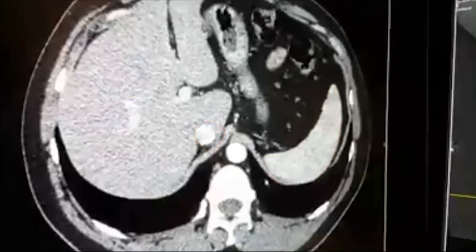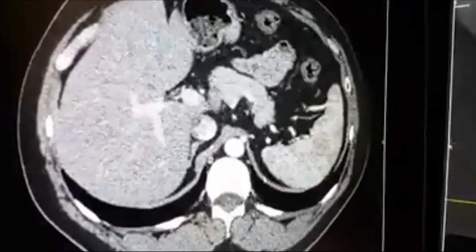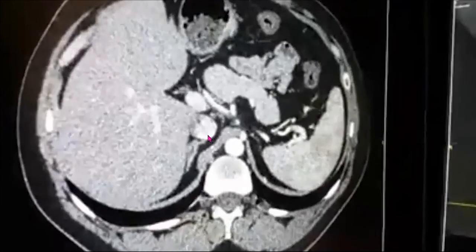Scroll down. So now we have just entered inside the abdominal cavity. This is liver, inferior vena cava. These are the bowel loops. And this is descending aorta, spleen, and this is the left dome. This is the right dome. Still, we can see the remnant part of left and the right lung over here. So that was all about the axial cross-section anatomy. Let us proceed further and discuss the coronal section.